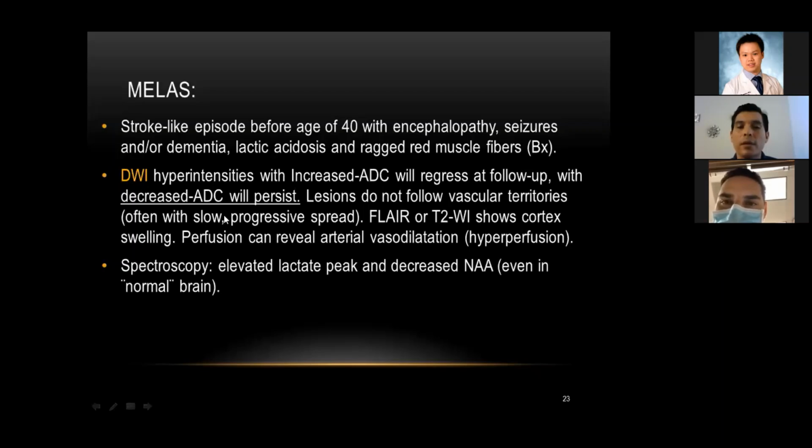Often it will spread, will follow a progressive pathology. In FLAIR and T2, we will see swelling, and hyperperfusion from vasodilation in the perfusion studies.